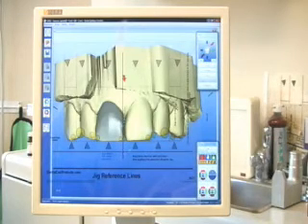After the refinement of the proposal is completed, we can send this restoration to mill. Since in this case we were doing two restorations, we were complete. If we were doing more restorations, we would have to go through the steps of doing the quadrant function as demonstrated prior.